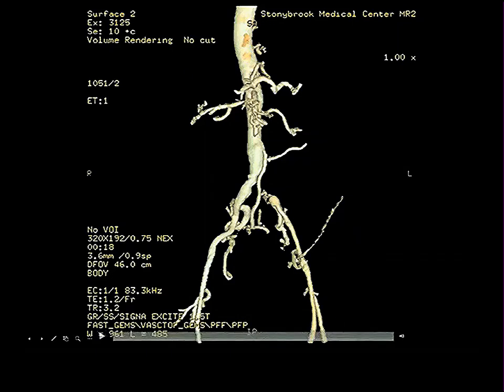Well, the inferior epigastric is probably the beginning. The inferior epigastric runs towards the belly button. Yes. This is the deep circumflex iliac. You never see this sort of thing. But it's probably very big in this person, again, because of the anastomosis. It's one of the things that's helping to fill the vasculature, because of the anastomosis of the deep circumflex iliac with intercostal arteries and lumbar arteries, it's being filled in a retrograde fashion and helping to fill the occluded left iliac system. So I just thought that was interesting.